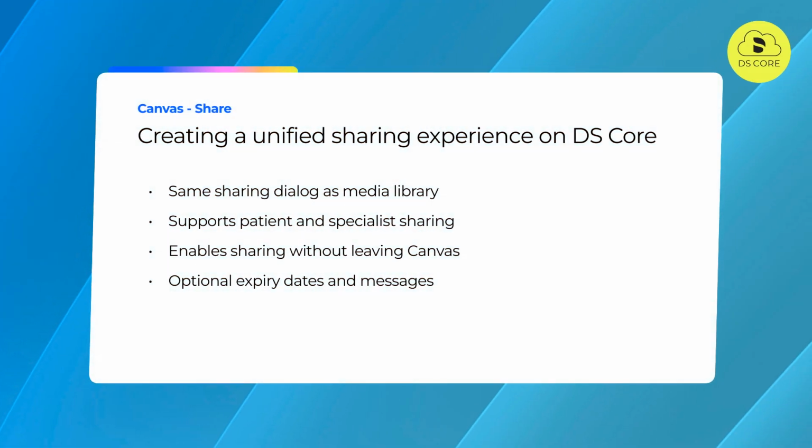Sharing from the canvas now mirrors the sharing workflow from the media library. This means you see the same interface, the same options, and the same sharing logic, whether you're sharing from Canvas or from Patient Media Library. The extension also introduces specialist sharing directly from the canvas, in addition to the existing patient sharing option.